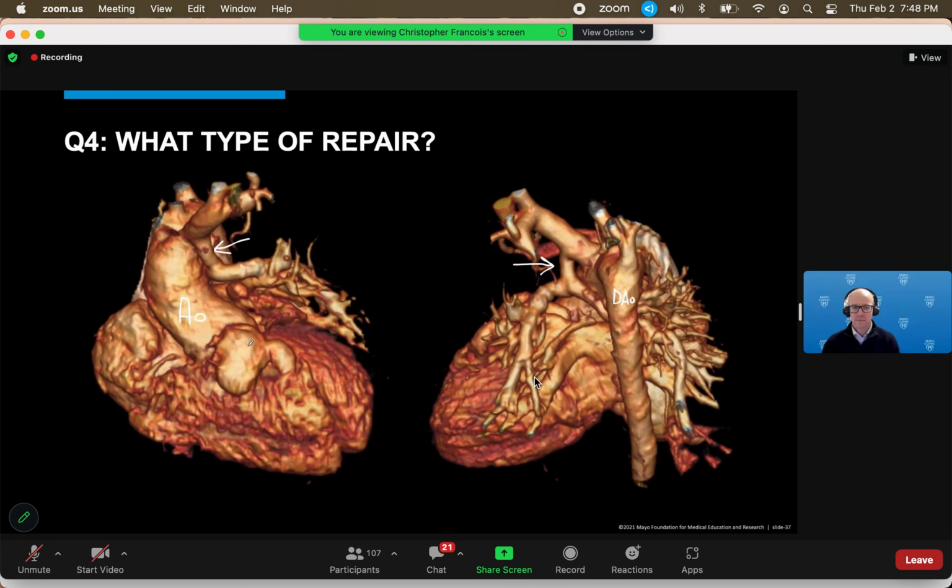And the pulmonary artery is arising probably from the left. So transposition of the great arteries. Yeah, so there actually isn't a main pulmonary artery in this case, and so that's why they've done a shunt between the aorta and this is going to be the left pulmonary artery right here. This is the left pulmonary artery over here.